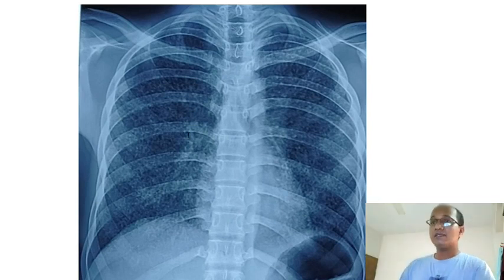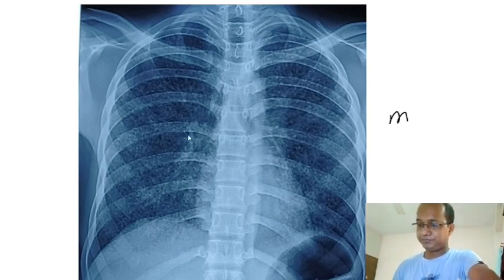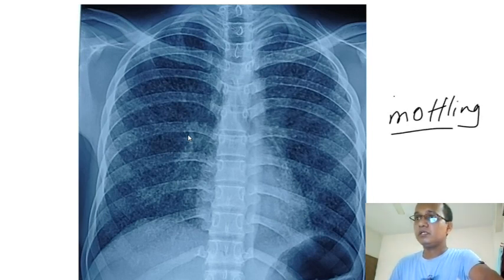Mind it, the reticulonodular shadowing is very fine here, and actually it is called mottling.